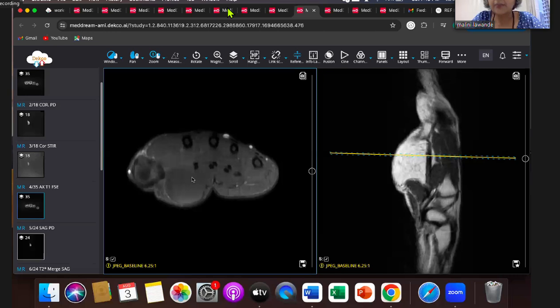Somebody said lipoma arborescens. So lipoma arborescens is intra-articular. It is very common especially in the knee joint, and we have seen cases in the elbow joint, but mainly we see it in the knee joint. A patient who has chronic synovitis, chronic synovial thickening and effusion, could be due to inflammatory arthritis, could be post-traumatic or any arthritis, and then synovitis. That synovitis will develop areas of fat, which are like frond-like areas, and that is lipoma arborescens. So it's not like a separate entity on its own. Chronic synovitis forms a lipoma arborescens. So that's intra-articular, not in soft tissue like this.